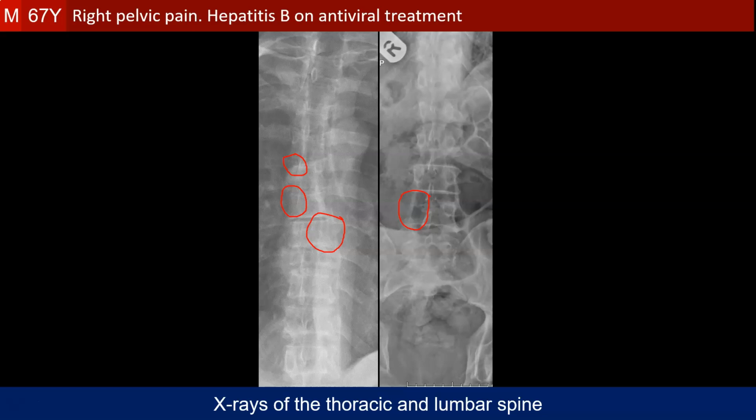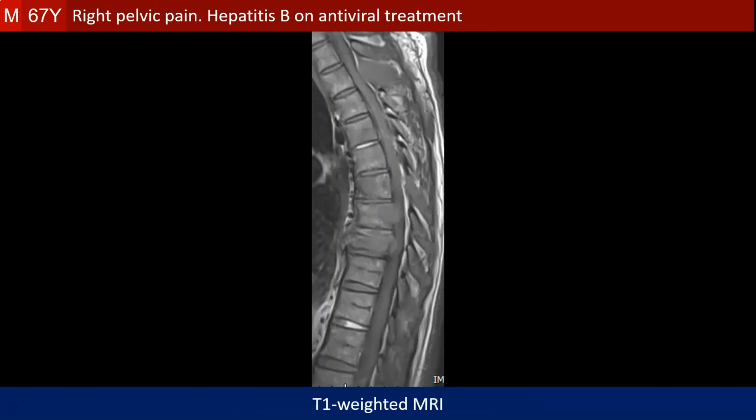And for those who are exam-oriented, this is also a very important point to be taken in consideration, particularly if you are provided with a chest X-ray that shows the spine with sufficient clarity, and there may be a missing pedicle there. Because of all these findings, MRI of the spine has been performed, and on this sagittal T1-weighted image of the spine, we see two important features. First, the lesions are having higher signal intensity than the spinal cord.